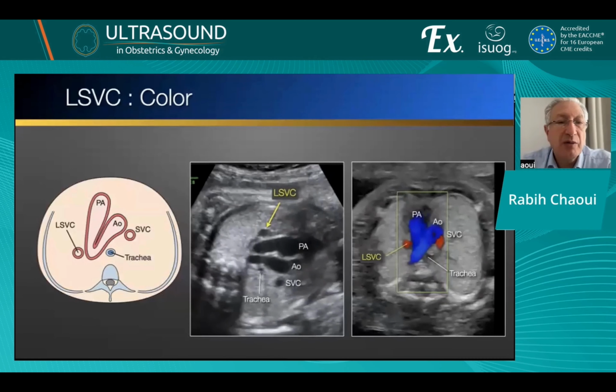With color Doppler, we may see, if you have an oblique view, that the two veins, the right and the left side vein, are going toward the heart, in the same direction, while in some cases where you have such a structure, it could also be a vertical vein. In a case of an abnormal lung vein drainage, the vein will go up into the upper thorax. So this is why I'm using this to demonstrate this.